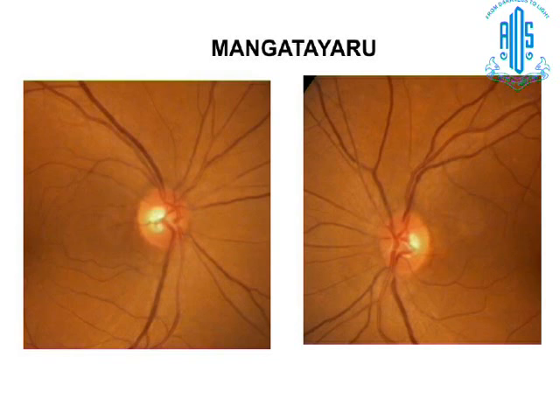In this case, glaucoma is suspected. This is looking normal. If you see both the discs, the disc shapes are different. This is more vertical and this is more round, and there is a vertical cup. You always remember one thing: when there is a small disc, even if you see a small cup, you always suspect glaucoma. That is a very, very important point. You remember this disc with this cup.